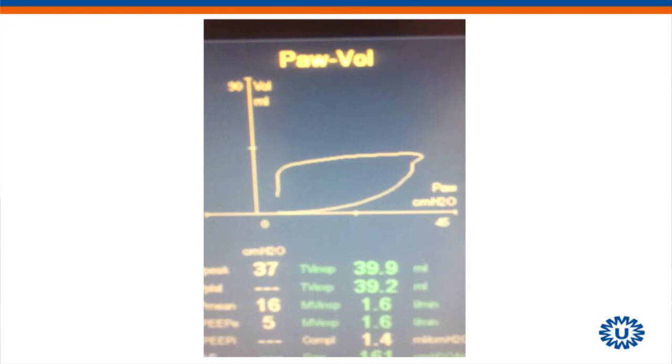Next one. We're looking at the pressure volume loop. Yeah? The movie isn't completely sharp, but I hope you can see it. Think about a bird. The penguin. Do you see the penguin? Yeah? Still more pressure is needed and almost no volume is going in.